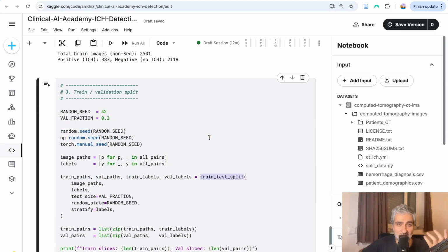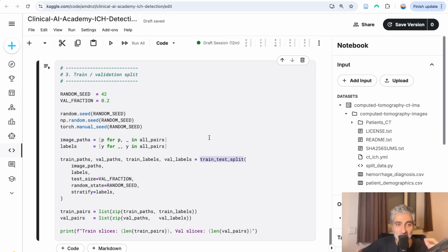And this is the idea that I told you: it's about understanding the steps, like pre-processing, loading the data, and then now doing this splitting. It's not about the coding itself. Once you understand the overview, you really don't need to code that much. It's already done for you by others who prepared those great libraries.